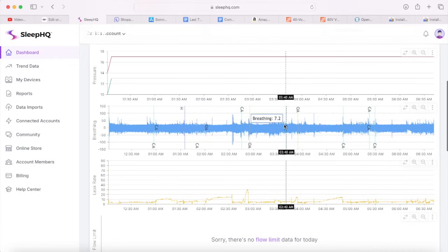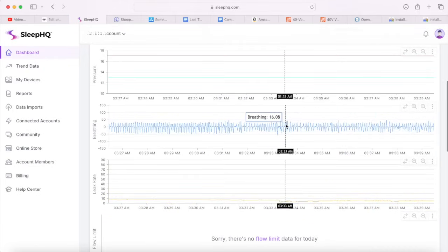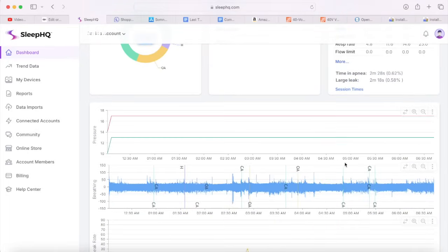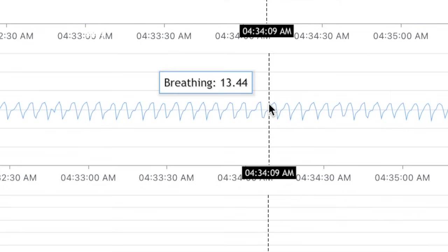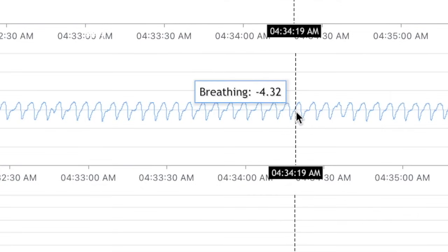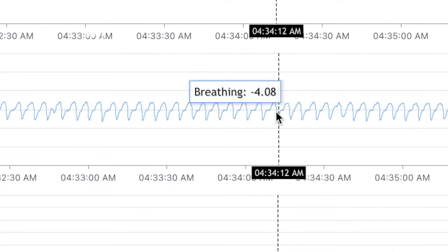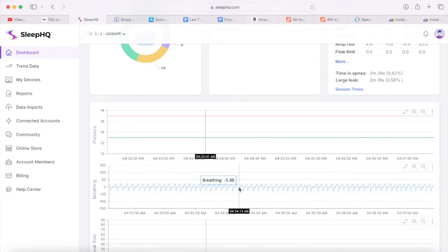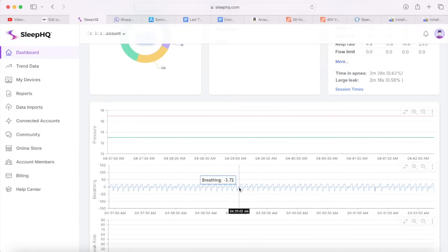But basically the functionality is pretty much the same. It's just a little bit, I would say a lot, slower because it's web-based. So it's having to upload all that data and try to render it quickly. So I'll show you what I mean by that. If I zoom in tight, you'll notice these are really skinny, and then it'll do a pop, and you see how it just changed there? It does a little pop as everything renders in smoothly. But if you're trying to scroll through large amounts of data quickly, it makes it tough.